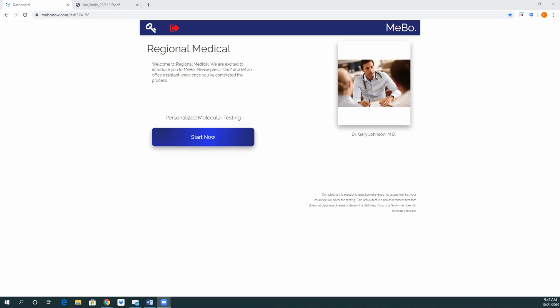We're going to be talking about the application that resides on the tablet that we actually provide to the doctor and their staff. It's called mebo, and it's a proprietary application specifically designed for people in our field. We're going to do a quick demo on what the patient sees when the staff hands the patient the tablet in the waiting area, and the procedures that follow after, briefly. This module is not going to discuss what is required to get these tests approved by the doctor, but that will be covered in another module.